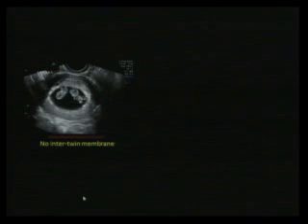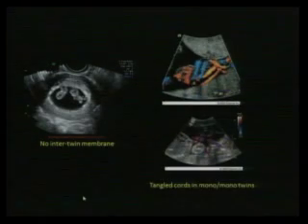Here's some examples here. Again, one gestational sac. We don't see a membrane, but we don't see the yolk sac. We don't really see the yolk sac either. So sometimes it's hard to tell, so you really want to look for those yolk sacs. Here, this is actually entanglement of the cords. This was also mono twins.